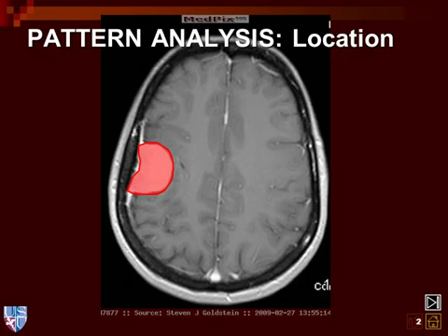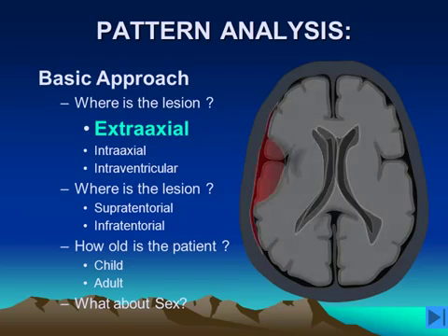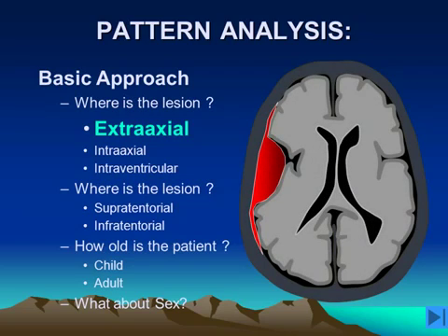After we give contrast material, we can see on this T1 weighted MR image that the lesion is enhancing, and there is also enhancement of the dura underneath the hemispheric shaped lesion. So we have a classic extraaxial mass lesion. Extraaxial lesions are located outside of the brain but still within the nervous system. They are lesions that are external to the pial surface.